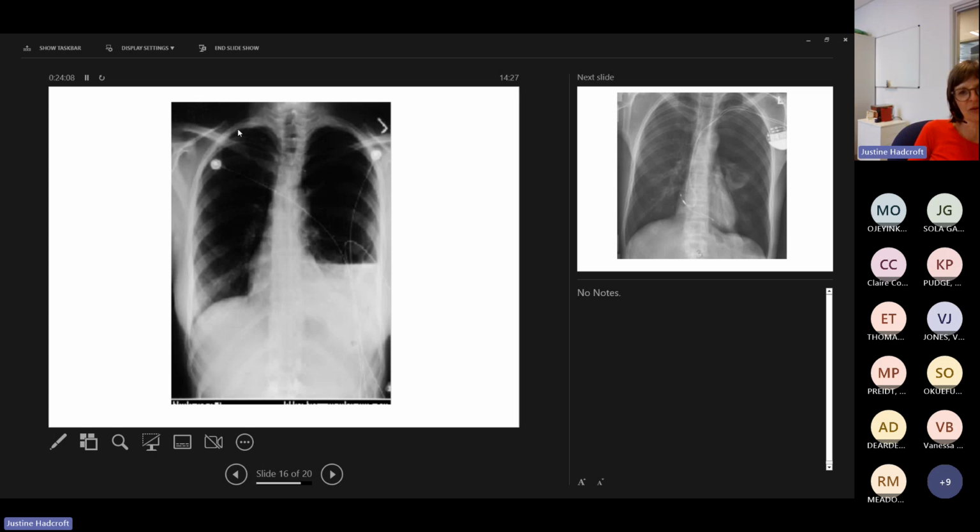What about this one? Kind of a bit similar to pleural effusions, but slightly different. Can you pick out the difference? So this is something at the left base here, and it's very dense, isn't it? So it's very dense, not like the consolidation. So maybe it's fluid, but can you see that we've not got a meniscus? This is a dead straight line across here, isn't it?